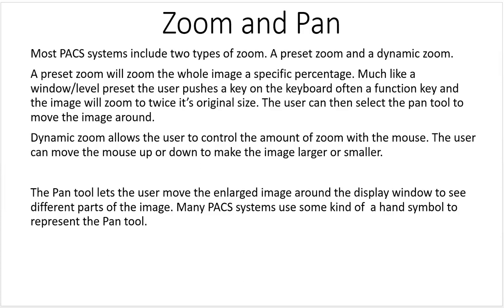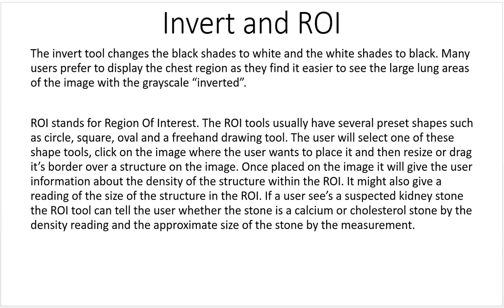Okay, here we go, part 2. Let's go on to the next tools, Invert and ROI. The Invert tool changes the black shades to white and the white shades to black.